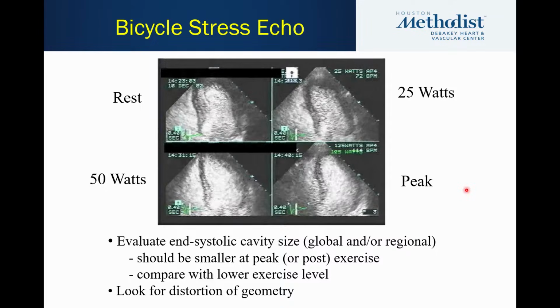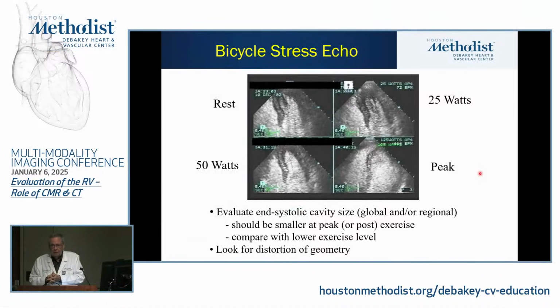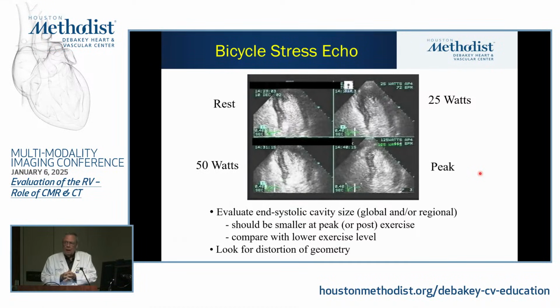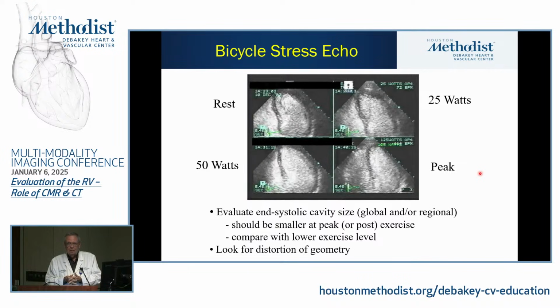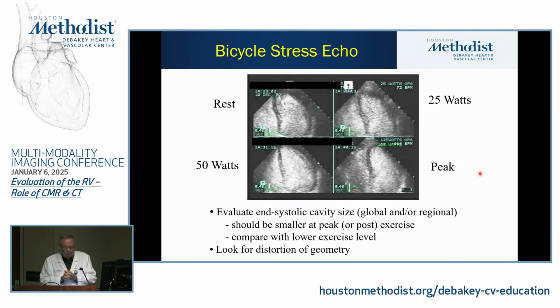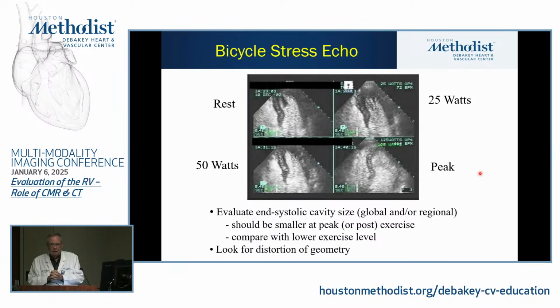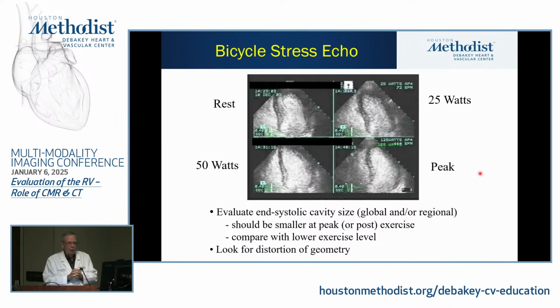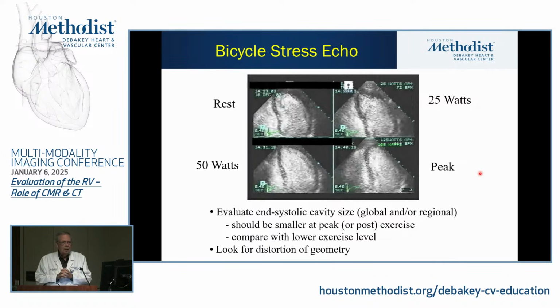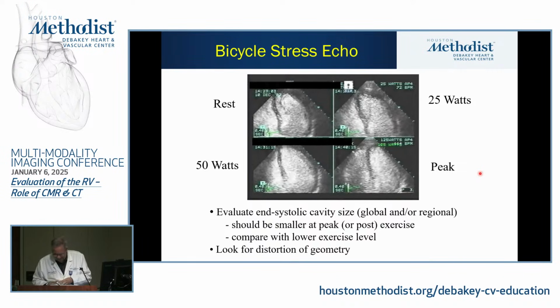So, my first question, just raise your hands. How many of you think that this is normal? Okay. How many of you think this is abnormal? Okay. All right. How many think that this is abnormal in the LAD territory? How many of you think that this is abnormal in the RCA territory? How many of you think this is abnormal in the circumflex territory? And the rest of you think it's abnormal, but you have no clue? Okay. All right.